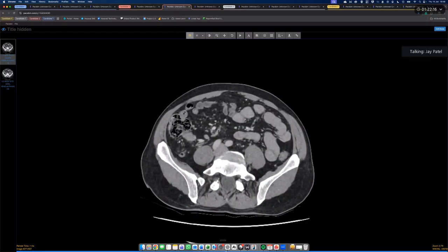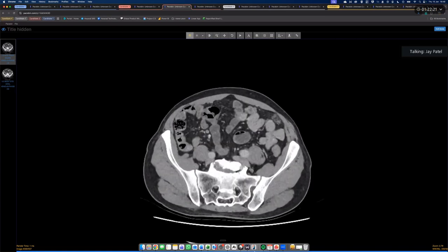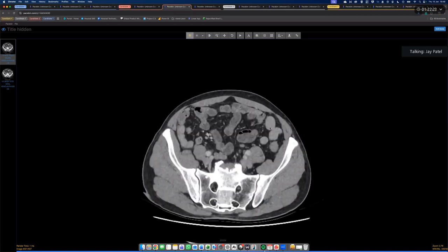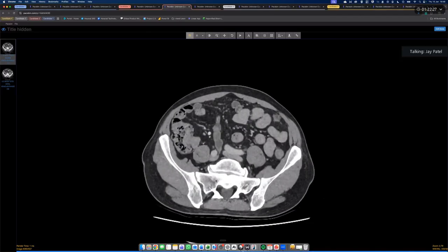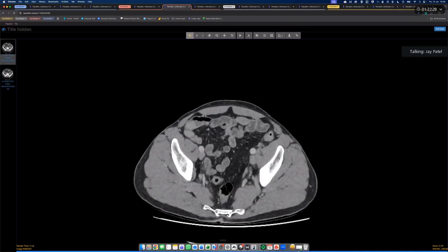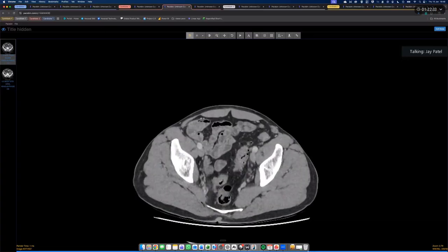These areas here will be peritoneal disease. There's another big blob of peritoneal or omental, that might be disease over there. And we've got a big plaque of peritoneal disease down in the pelvis, which is discrete from the bowel. So all this is disease.